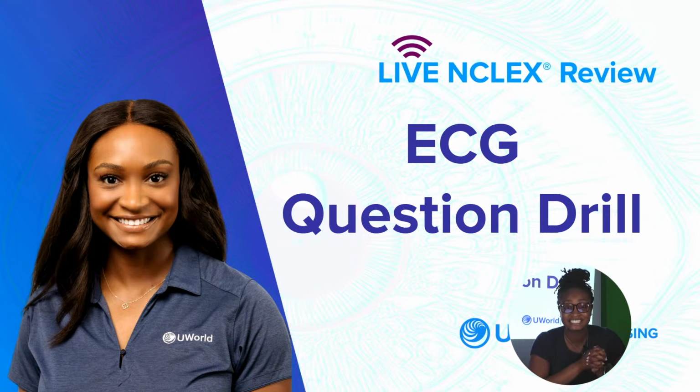Today's topic is ECG. We got a lot of requests to do ECG practice. So rhythm strips and recognizing the correct rhythms, as well as some interventions depending on what those rhythms are. So let's get started.